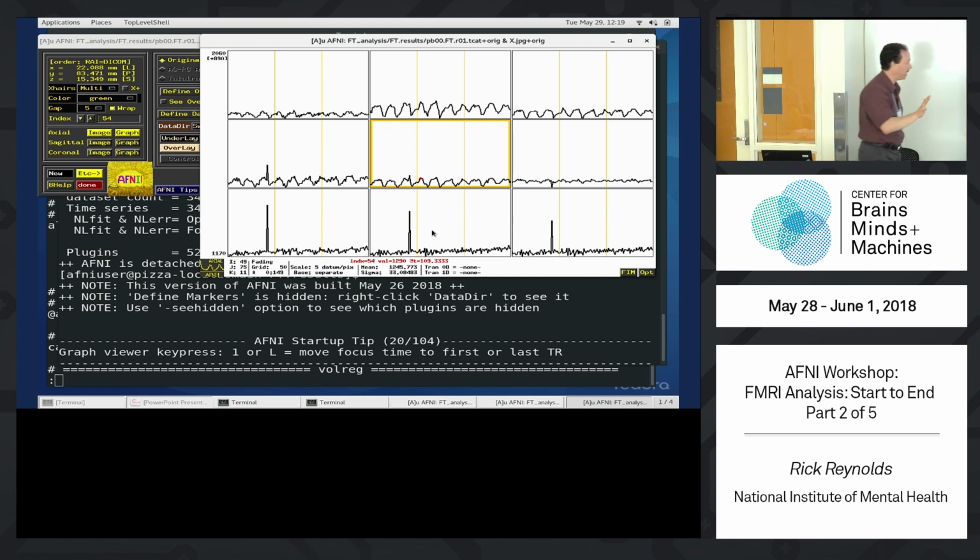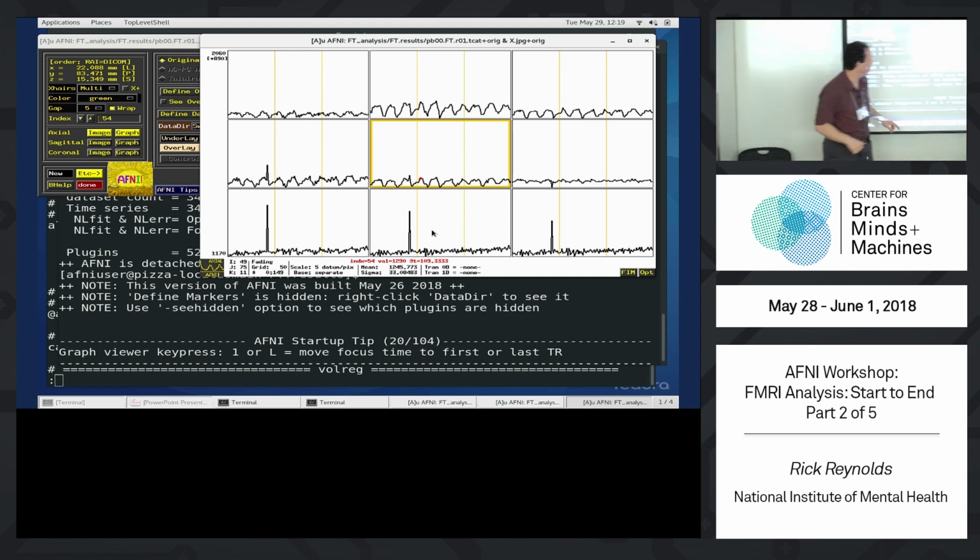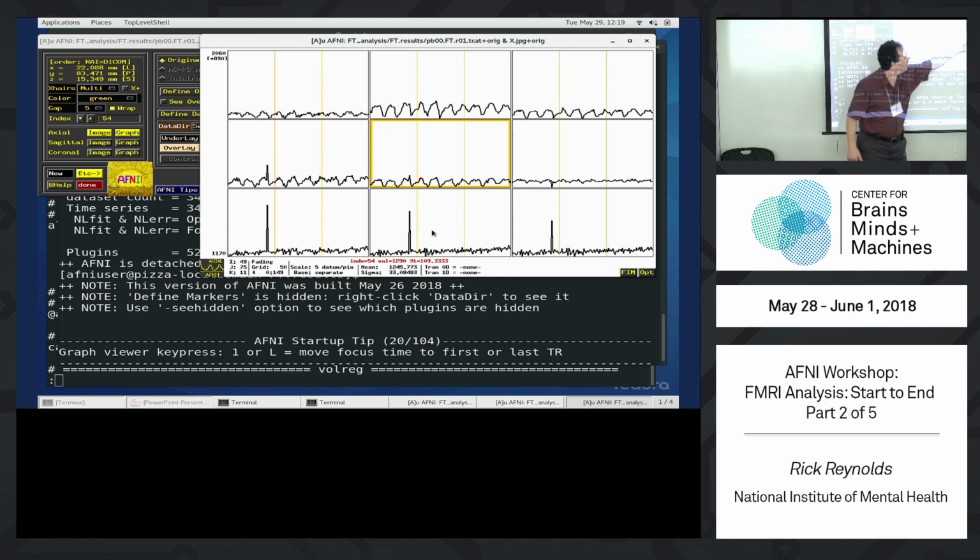Okay, that's a lot of babbling. I haven't even gotten to the time shifting stuff yet. So here are indices in the grids. We're on slice 11. That's 0 based, 0 through 11. So since it's odd, we're more than halfway through the TR, right? So if you notice the value, we're not at index 0.